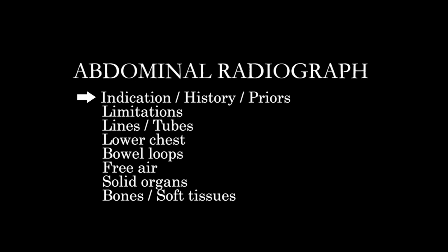Following known bowel obstruction, looking for ileus, or looking at general placement of support devices are the sort of indications you might get for abdominal radiograph. Radiographs are also still used in certain pediatric and neonatal populations and indications, but we're mostly talking about the adult here.